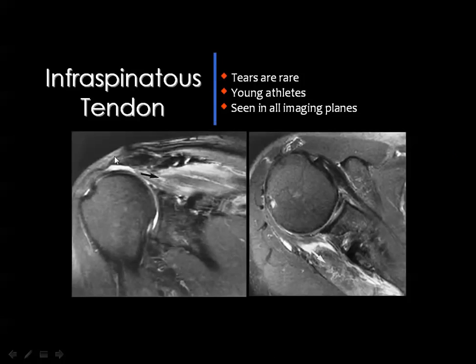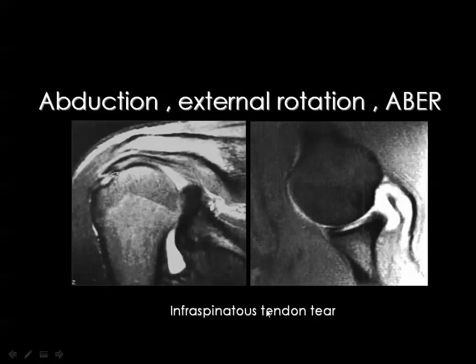In this example, you can see heterogeneous high signal intensity within the muscle, and you confirm that this muscle is the infraspinatus in the axial images, and you see the heterogeneous laceration and edema of the muscle in the axial images affecting the infraspinatus tendon, the infraspinatus muscle. And this is the spine of the scapula. As you can see, the inferior protrusion. Then this tendon will be the infraspinatus tendon, and you can see the rupture of the tendon at this side.